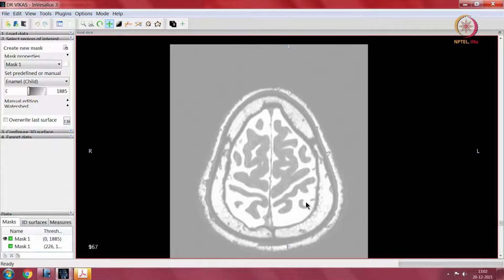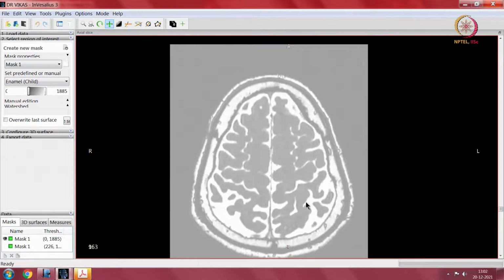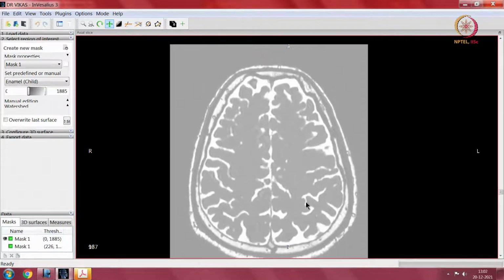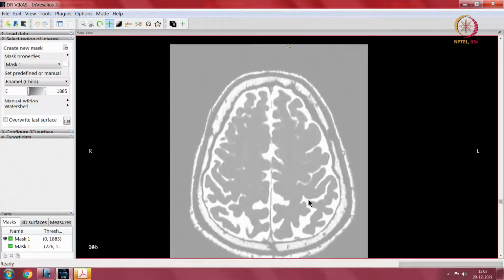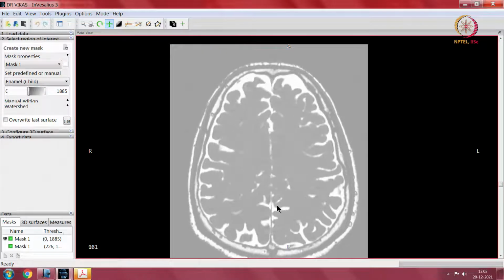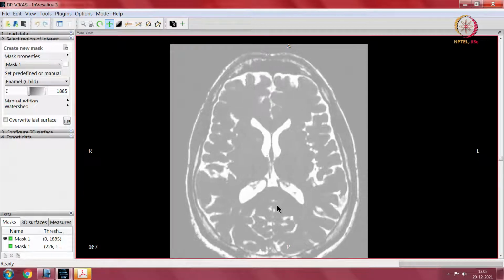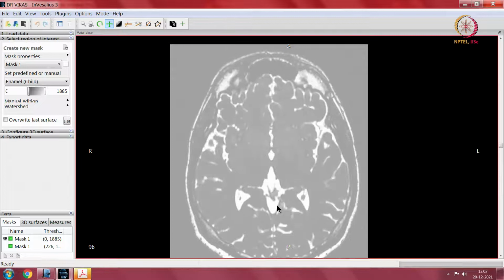The sulcus which divides the superior parietal lobule and the inferior parietal lobule is a lot more difficult to make out. It is approximately over here. So, this would be the superior parietal lobule and the inferior parietal lobule back there. Now, going further down you can't make out much, in fact.